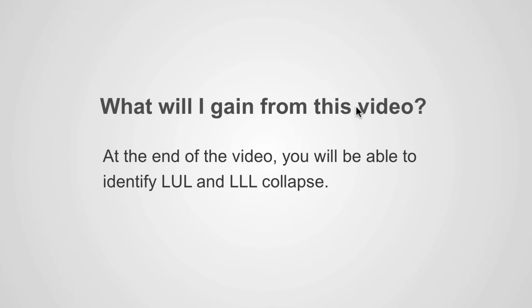What will I gain from this video? At the end of the video, you will be able to identify left upper lobe and left lower lobe collapse.